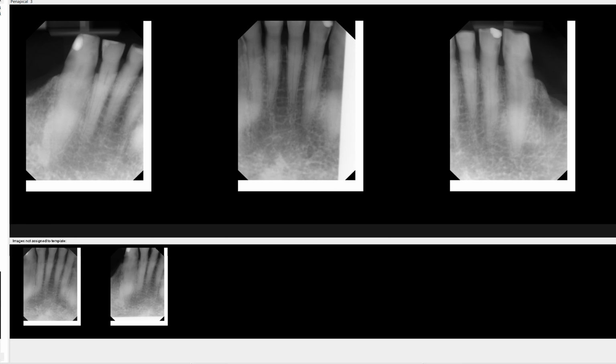Hello everyone. Here you're seeing three periapical radiographs that are taken in the anterior mandible. Tooth number 22 through tooth number 27 is what you're seeing. And if you could pay close attention to the mandibular central incisor projection, you are going to see two diffuse radiopacities that are located along the border of the radiograph.